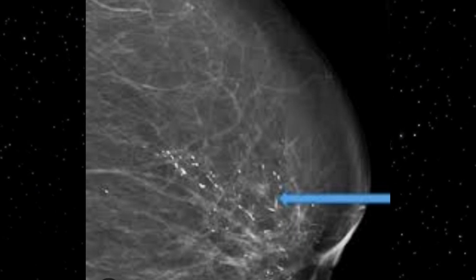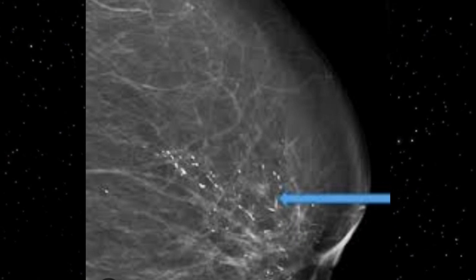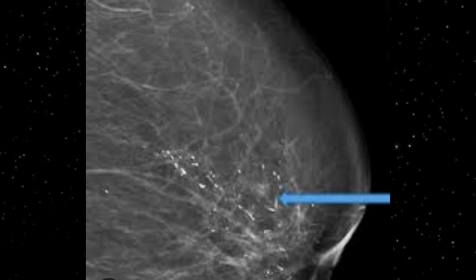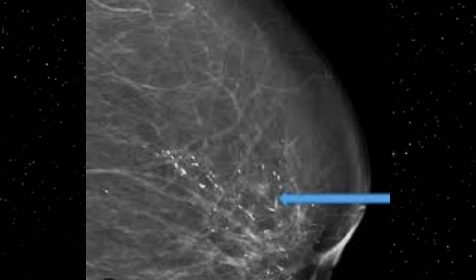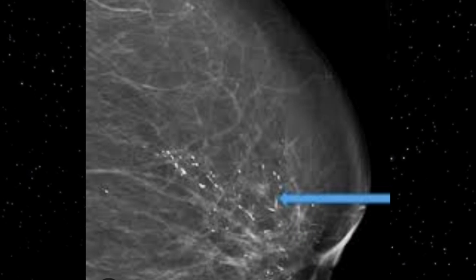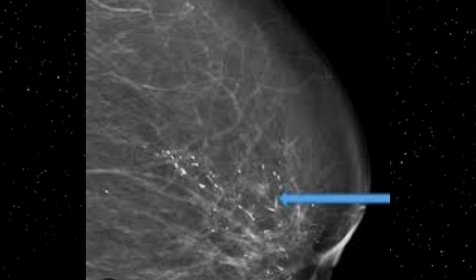Another presentation of ductal ectasia would be a lead pipe appearance. For example, if debris is extruded from the ducts into the adjacent parenchyma, then an inflammatory type reaction can occur, and fat necrosis calcification takes on this characteristic appearance. So it may appear like a broken needle, which you can appreciate on these images.